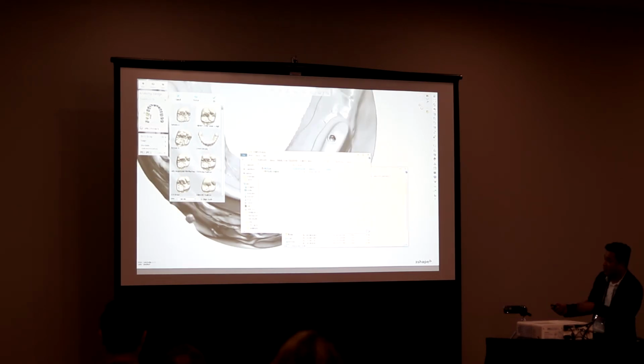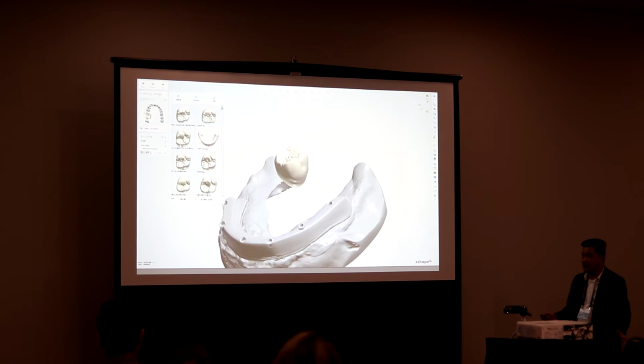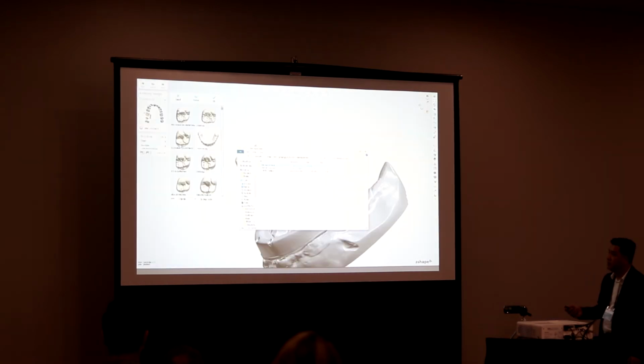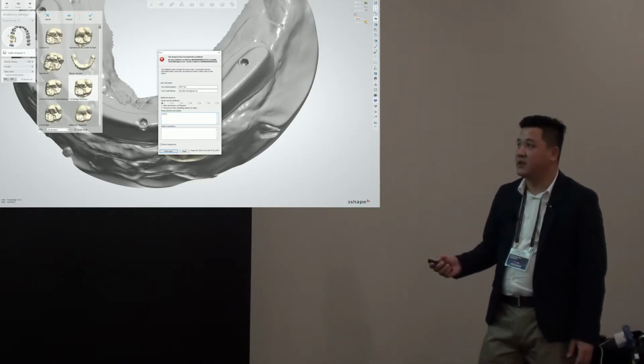I'll grab a different file. I'll rename it UNN3. We click on it. It loads in just fine, right? So we kind of have to compare and figure out what's different between these files and what we need to do in order to get the software to go past this error. So what do? Well, a magician doesn't give away all of his tricks and secrets.